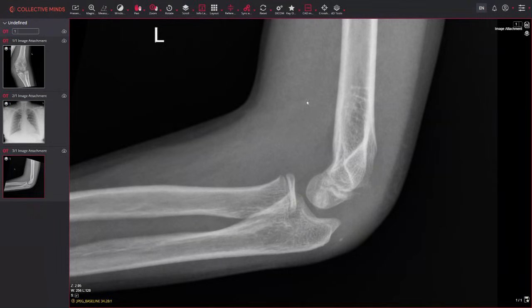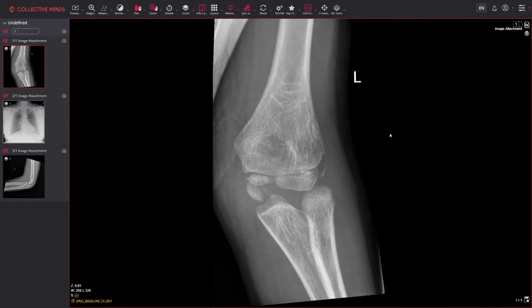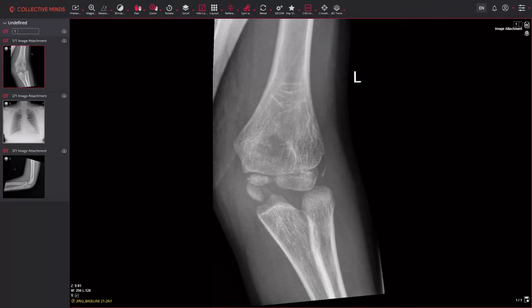Okay, and then once we've done all that, we can produce our report along with recommendations. So significant fractures will obviously need surgical fixation. They'll all need to be followed up in orthopedics. May need cast application, splinting if it's finger injuries. So just have a look at some of the follow-up options. The important thing for you guys, obviously, you don't need to go into any major detail. It's just to identify whether there's a fracture or not, basically, and then describe any of the secondary signs, like I said, with the joint effusion, any foreign bodies.